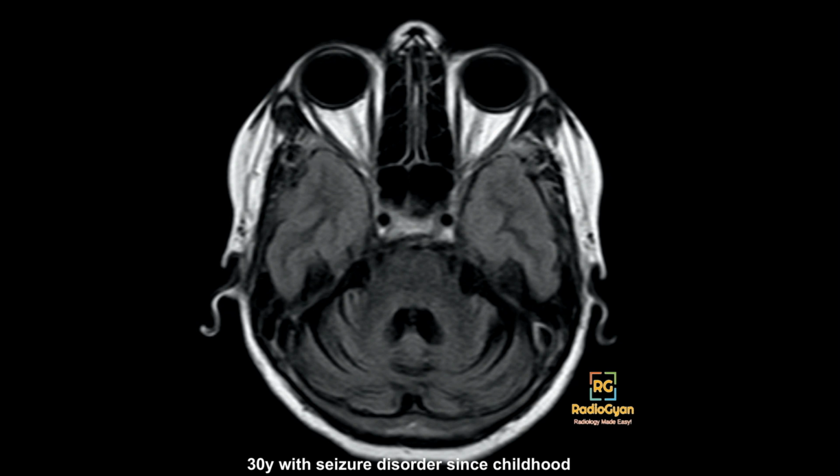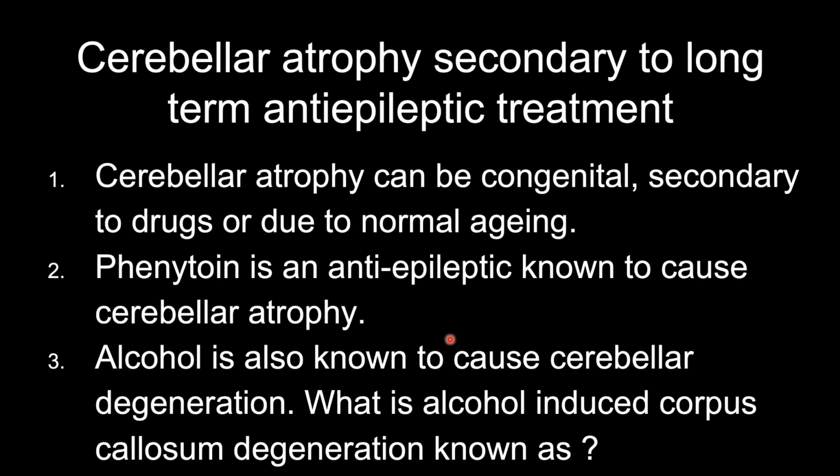So what we see here is diffuse prominence of cerebellar folia with relative preservation of the cerebrum. So what we see is diffuse cerebellar atrophy with normal cerebrum. This is a typical finding in patients with phenytoin toxicity. So the answer in this case is cerebellar atrophy secondary to long-term anti-epileptic treatment.